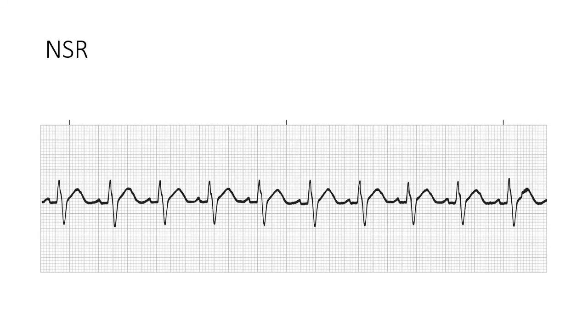Good start. Now, Joe mentioned that the T wave looks a little weird. One of the things to hold in the back of your brain as you get ready to move into the advanced sequence: when you see T waves that are weird like this, you want to begin thinking there may be a problem with potassium. The T wave begins to get really large when we have hyperkalemia or hypokalemia, high or low potassium.